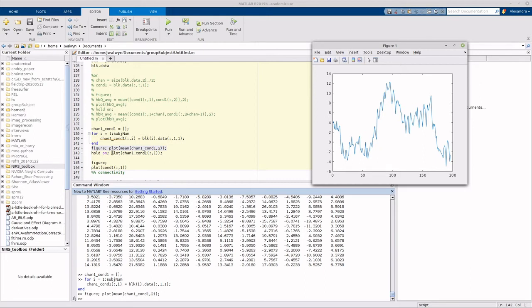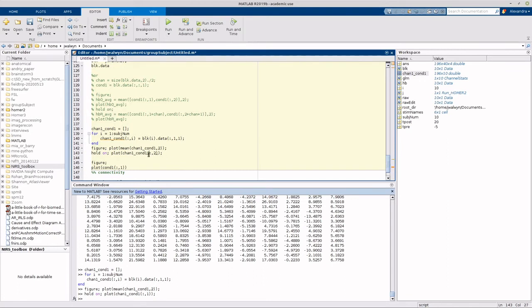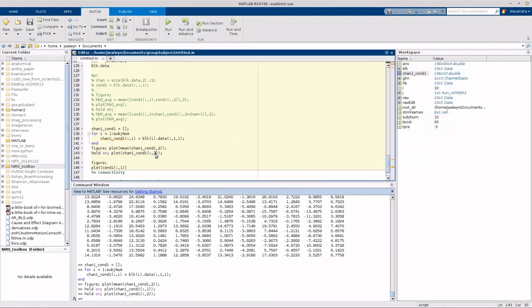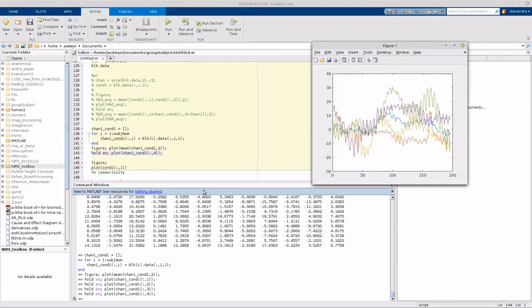But just to verify, we're going to go ahead and plot just the first subject for that value, right? So we can say hold on. Go ahead and run it. If we pull that up again, you'll see there's subject 1. If I want to, I can do subject 2. Boom. There we go. There's subject 2. And blue should be our average, right? So if we keep doing that, we should see something that starts to fall into place for the blue line, right? If we do subject 4, remembering there's only 10 subjects here, it'll start getting real messy real soon.